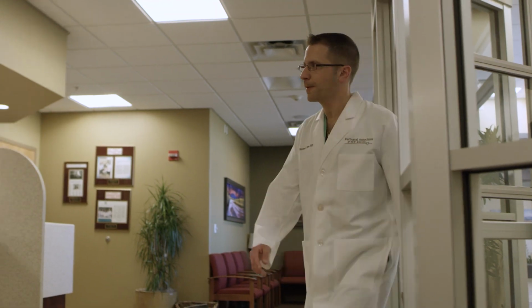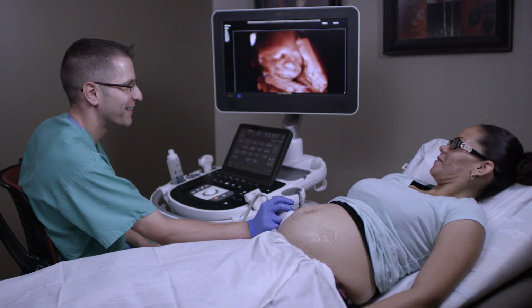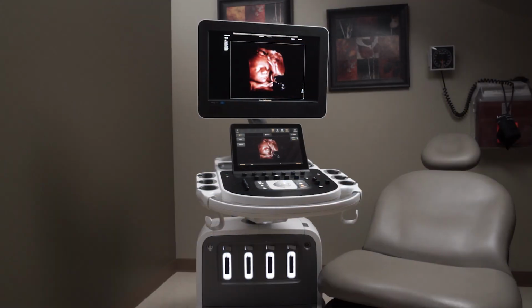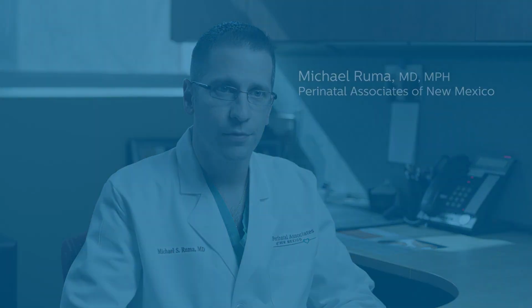My name is Mike Ruma. I'm a maternal fetal medicine specialist. I work at Perinatal Associates in New Mexico, and what we're going to talk about today is the EPIQ and Affinity ultrasound platforms, the latest release of software, which incorporates a variety of new features.